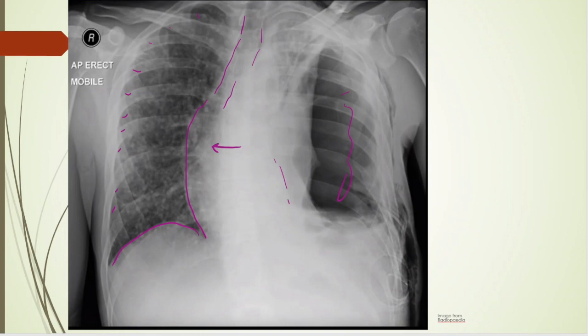Again, you need to take the clinical picture. A friend of mine, Jason Tangway, who's an emergency room physician, brought this point up that I didn't realize before, is that you really need to have a clinical picture of a tension pneumothorax as well. So in any case, we're just looking at x-rays alone, but I would call this a tension pneumo.